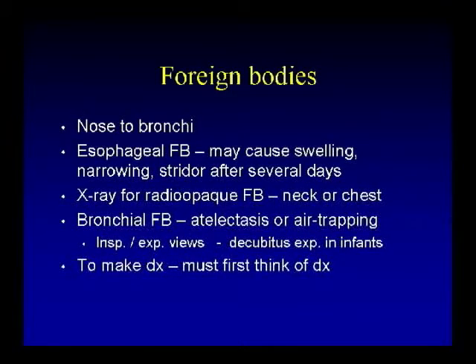So foreign bodies are important. They can occur anywhere from the nose down to the bronchi. To make the diagnosis, you must first think of the diagnosis, and if you don't live in the pediatric medical world, sometimes it's hard to remember the kind of trouble that kids get into. Here's a case from our ICU a few years ago. It was right middle lobe pneumonia and some left lower lobe pneumonia, and for days we just said, oh, we also had a positive RSV. So we never got a lateral view until they said, oh, by the way, there's stridor.